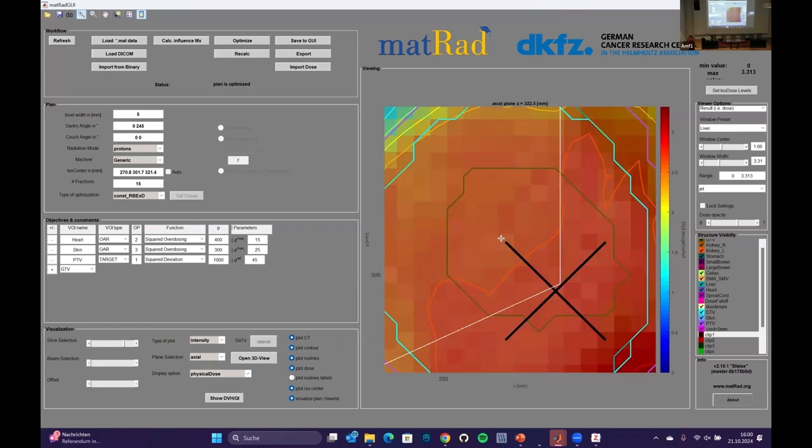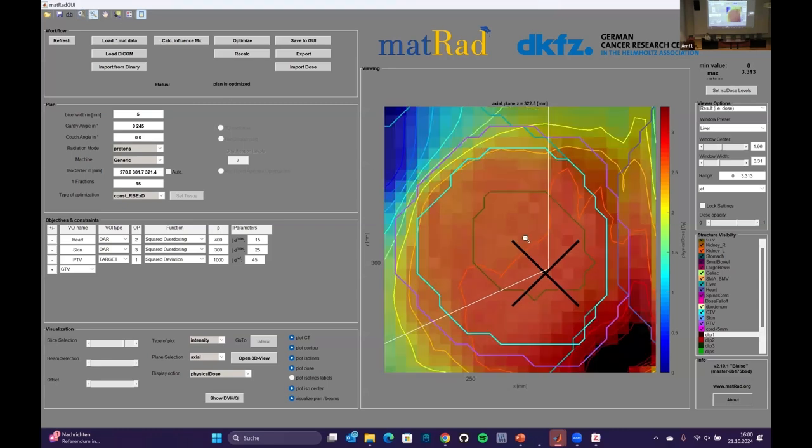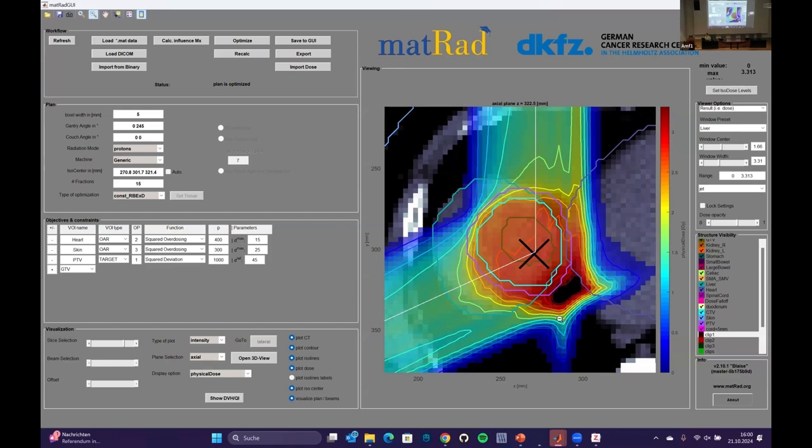I zoomed way too far in. So you really see that Bragg peaks that were here were shifted 5 millimeters down where they did not pass the liver tissue here, so they end up depositing all their dose here. So you see that this is quite a big problem.